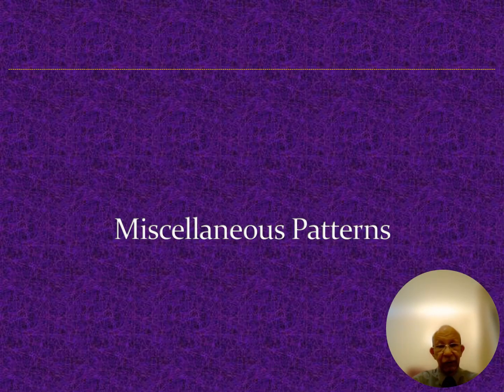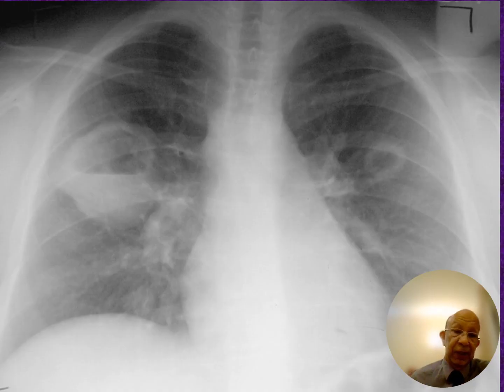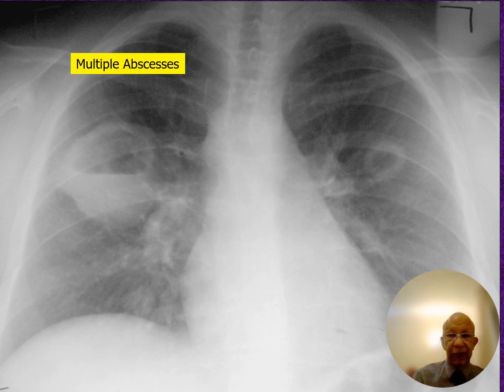Okay, now I'll just go through some miscellaneous patterns. Right now, this is typical of a lung abscess with a fluid level. There are multiple, another cavity there, right? And this is the fluid level. So this is lung abscess.